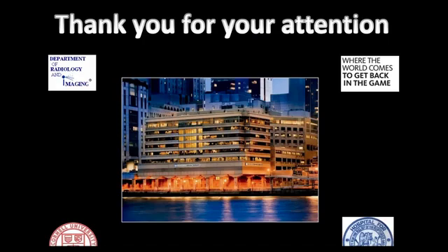Some places I practice have used it routinely, and you do it as a sagittal image. I think it helps you not have to bring somebody back for a little lesion that is maybe an atypical hemangioma, because once in a while you do bring them back. So I'm a fan of in and out of phase imaging. It's very quick, do it in the sagittal plane, and it'll be a problem solver.